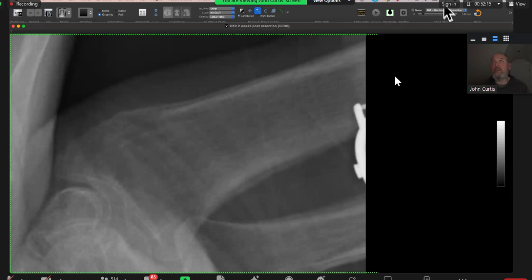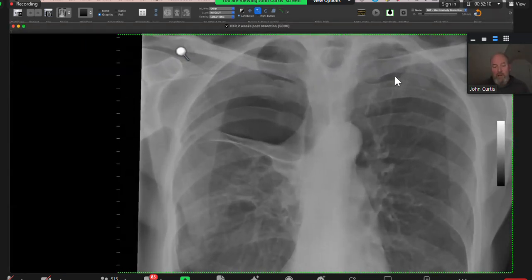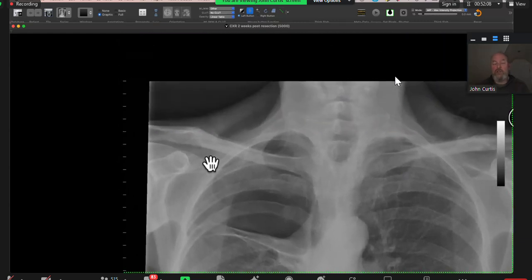And have you ever seen that in the clavicles? No, I've never seen it before. So what do you do if you've never seen something before? Compared to previous. Yeah, that's always a good suggestion. Go and ask a colleague, maybe. Are you allowed to say that in the exam? I guess you can because you're being a safe radiologist. Exactly. But you're not allowed to do it for every question though.